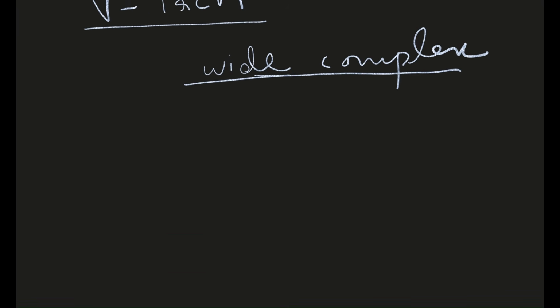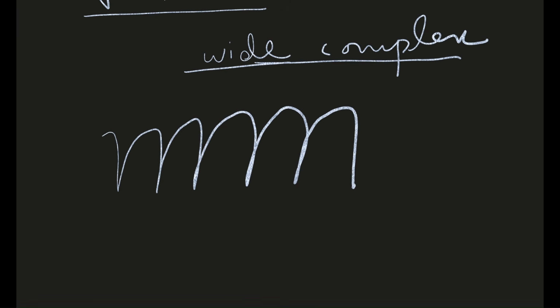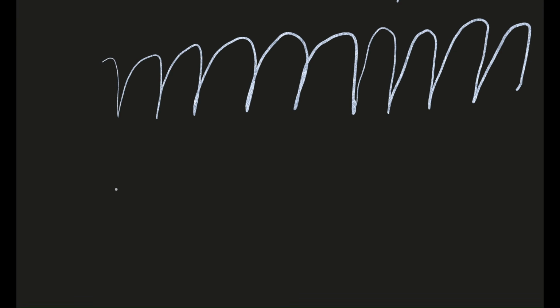However, I am only going to talk about V-Tach over here. If you see a pattern like this, roughly sawtooth, or the QRS complex will lose its proper shape.